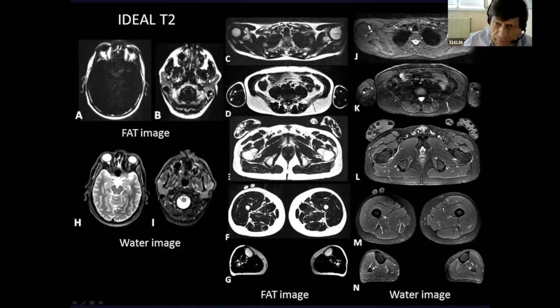In clinical use of this type of examination, we use fat image and water image with the same aspect of T1 image and STIR image. What is important is to see abnormalities in the brain with water image in order to detect, for example, leukodystrophy, like in congenital muscular dystrophy type LAMA2, for example.